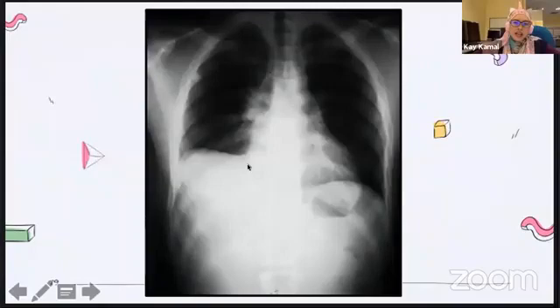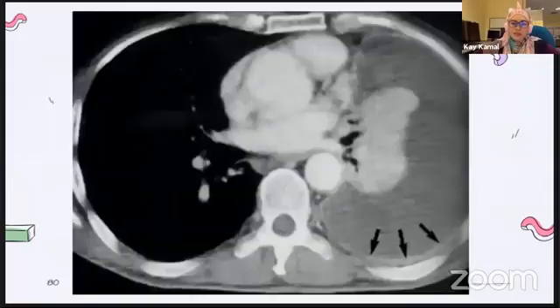And this is a high hemidiaphragm in subpulmonary effusion. Remember I told you that the hemidiaphragm could not be more than 2 centimeters different. If it's more, then we might have to think of what is the cause. Is it the right-sided problem or left-sided problem? In this case, it's the right-sided subpulmonary effusion.